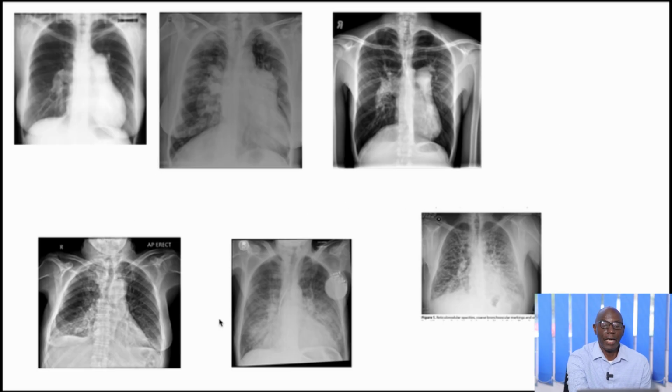Let's look at some examples here. If we start with pulmonary hypertension, there are so many causes of pulmonary hypertension, but most of them commonly appear the same on a radiograph. The basic finding here is the prominence of the centrally located pulmonary vessels, which cut off. There is immediate cut off, as you can see in that image, which is called pruning. Once you see something like this, then you are suspecting pulmonary hypertension. Prominence of the central vessels, which truncate or cut off immediately.